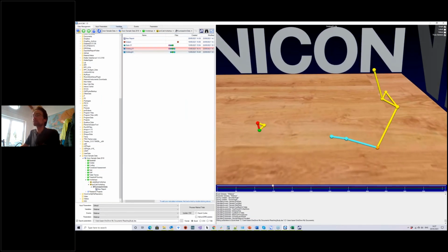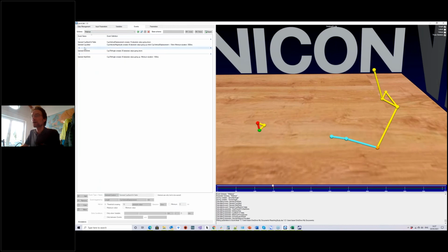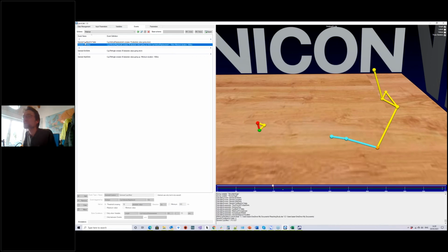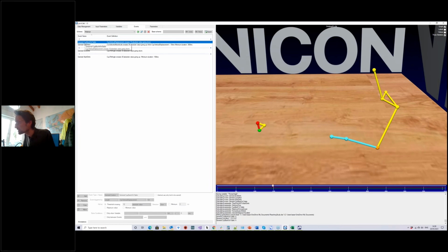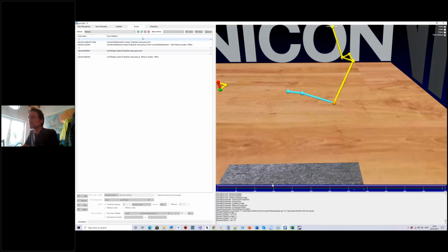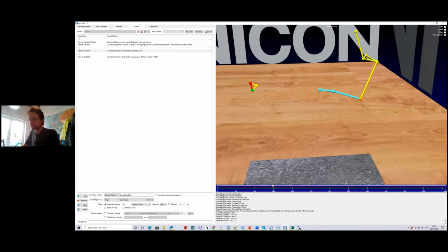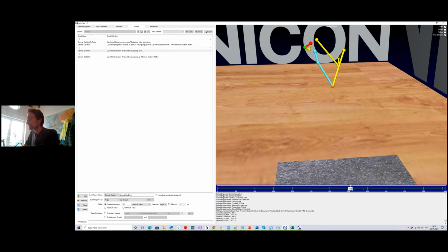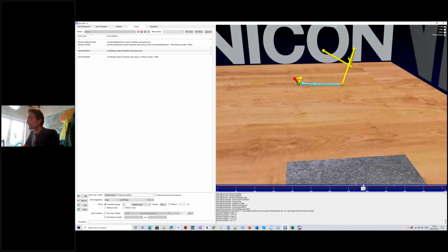So basically here in events, I go to the one event that was identified twice, which was, which one was it? Not this one, not this one, but this one, general end drink. Yes, in fact, I forgot a step in my, yeah.